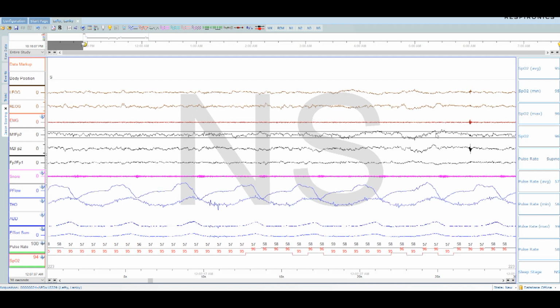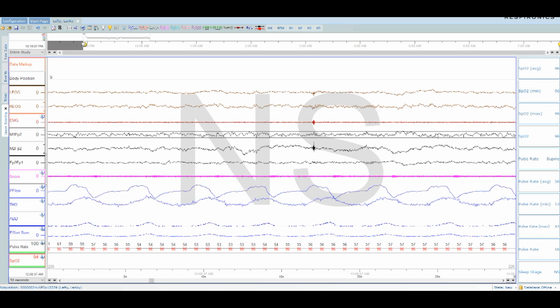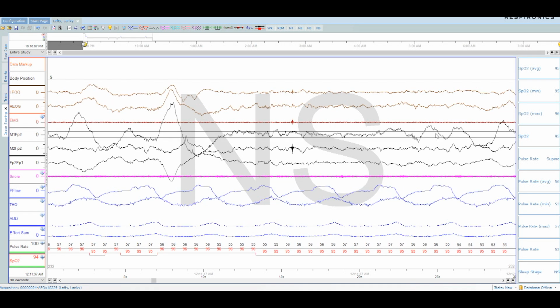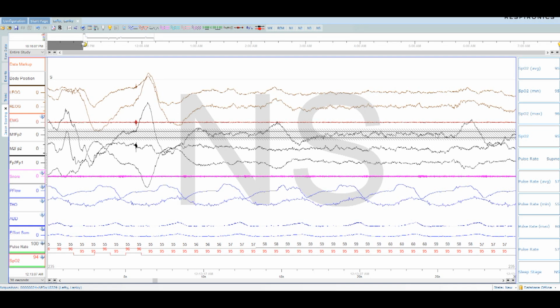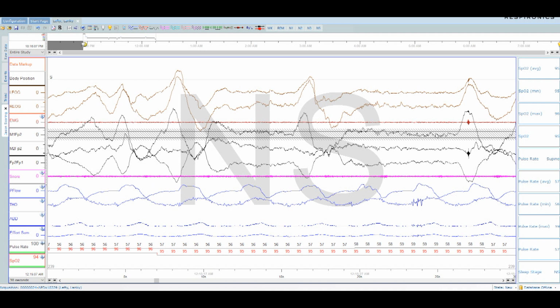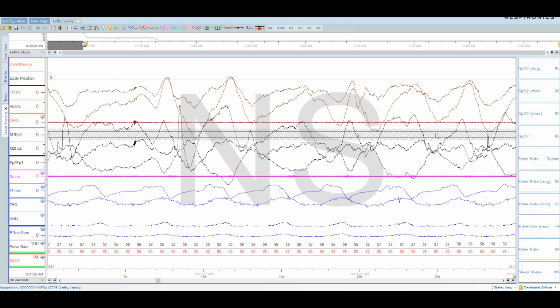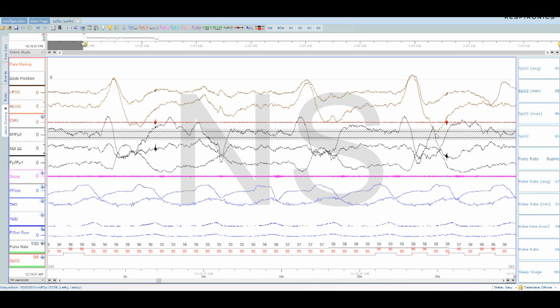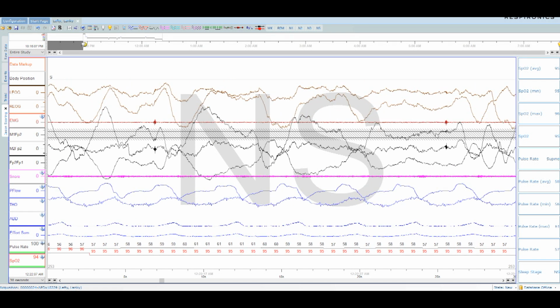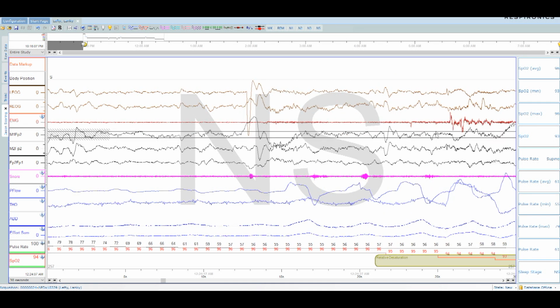So we're calling this N2 right here. Even though it's all very attenuated, it's looking as if it's attempting to be REM there for a period. Now it's decidedly not trying to be anything close to REM. This is delta, stage 3. All this is stage 3. See how massive these waves are? Stage 3 doesn't usually hide. It usually pops out and lets it be known. Like, hey, I'm stage 3.